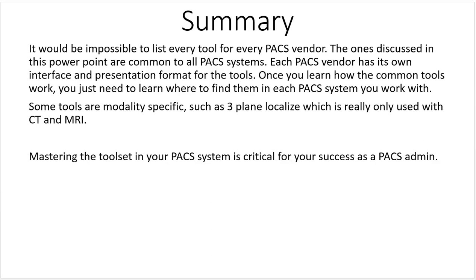It would be impossible to list every tool for every PACS vendor. The ones discussed in this PowerPoint are common to all PACS systems. Each PACS vendor has its own interface and presentation format, or GUI, for the tools. Once you learn how the common tools work, you just need to learn where to find them in each PACS system you work with. Some tools are modality specific, such as 3-plane localize, which is really only used in CT and MRI.